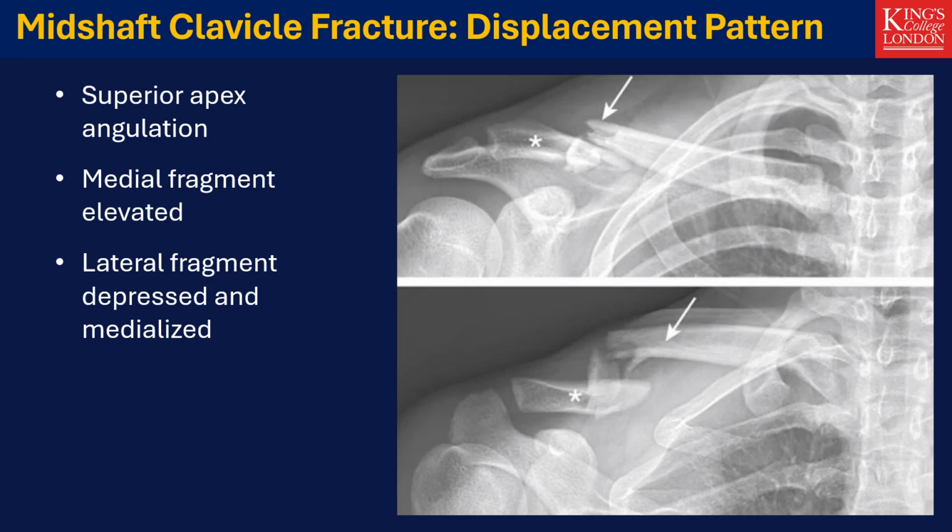The lower image is a cranially angulated view. It better demonstrates the fracture comminution and displacement.